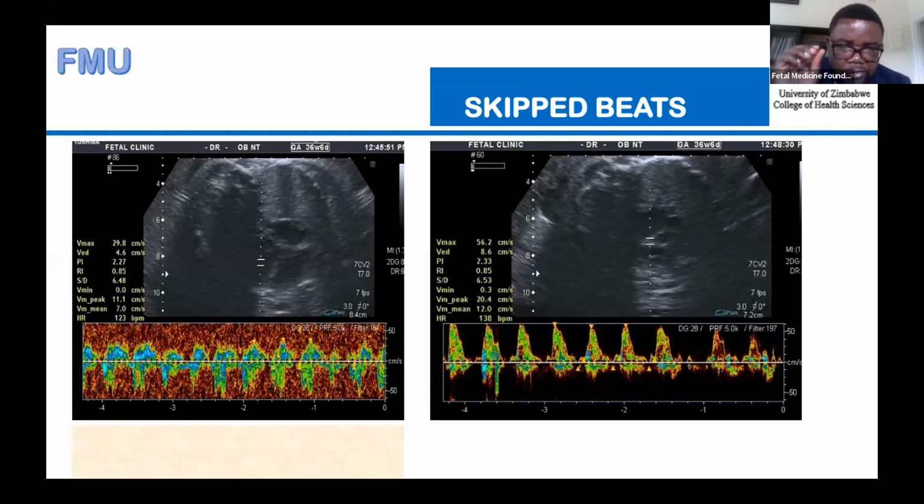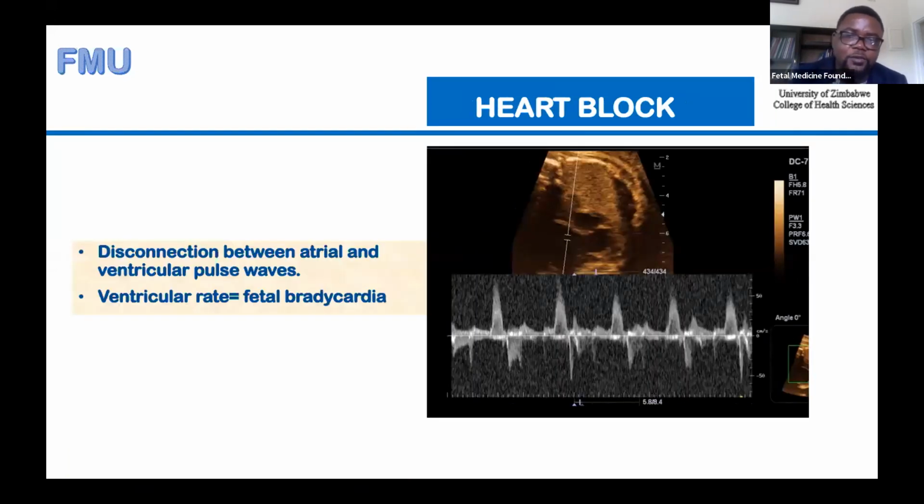But if you just throw your pulse wave where there is something that is just beating, there is no way you are going to make this kind of diagnosis. In most cases, these babies may be sectioned for an irregular heartbeat if proper assessment is not done. So this is how serious these issues are: if the heart rhythm is not examined, obstetricians will do a knee jerk. If the baby's heartbeat is not okay, a section should be done, which is fair if you don't know what you are dealing with, because sometimes this may save the baby.